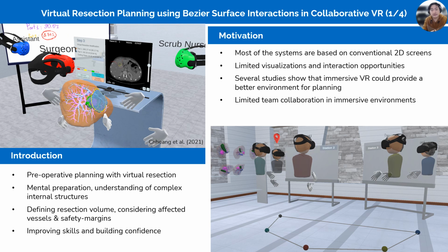However, most of the systems for surgical planning are based on conventional 2D screens, which could offer the user limited visualization and interaction opportunity compared to a VR setup. Several studies show that immersive VR could provide a better environment for surgical planning.